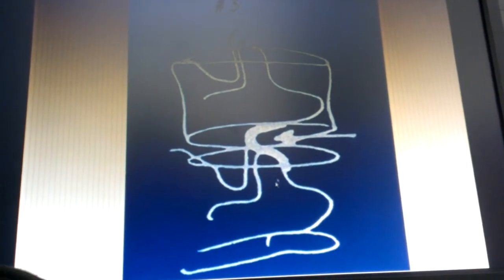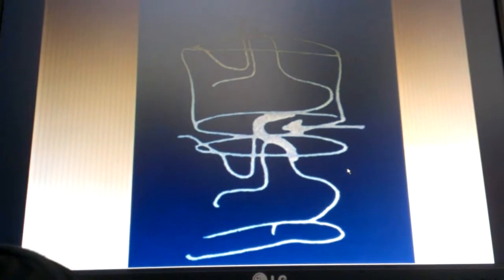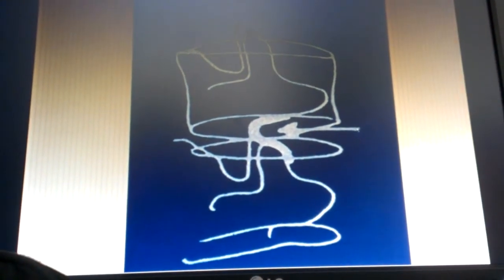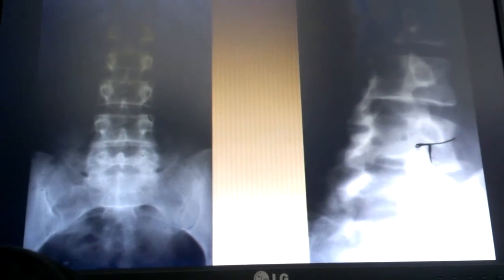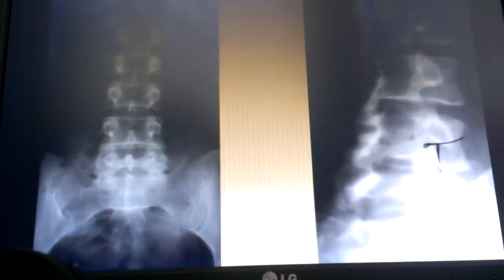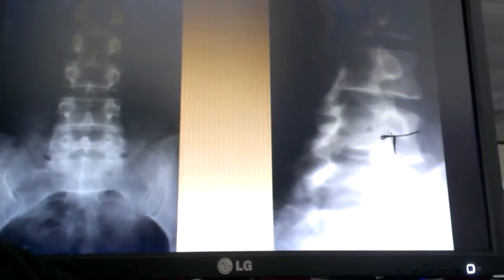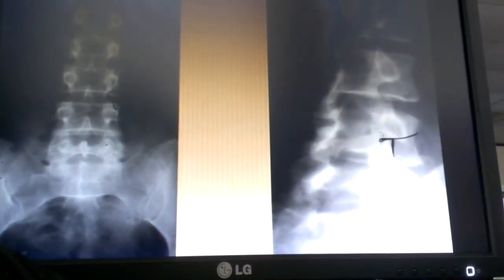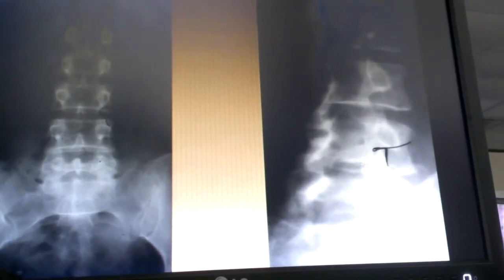But with a lot of degenerative processes, it's hard to see those articulations because there's sclerosis and there are hypertrophic changes above them. So this is kind of the latter situation that I spoke of, where the superior articular process is sinking into the anatomical neck of the Scotty dog. So that would be abnormal.